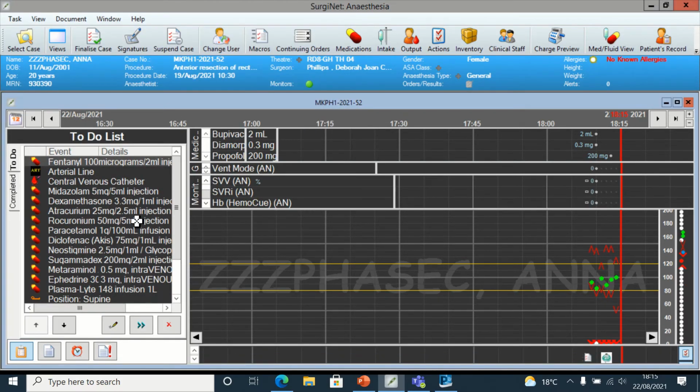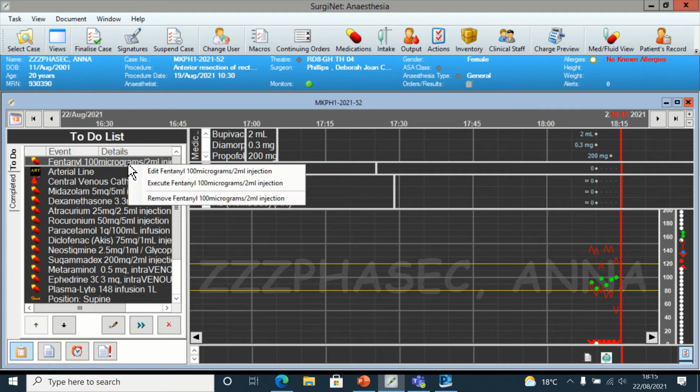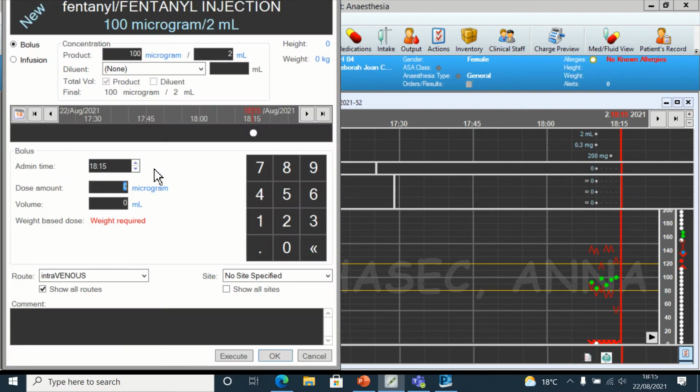Press execute. Fentanyl. Edit. Let's say I gave 200 of that as well. Sorry, 200. Choose the right time. Execute.